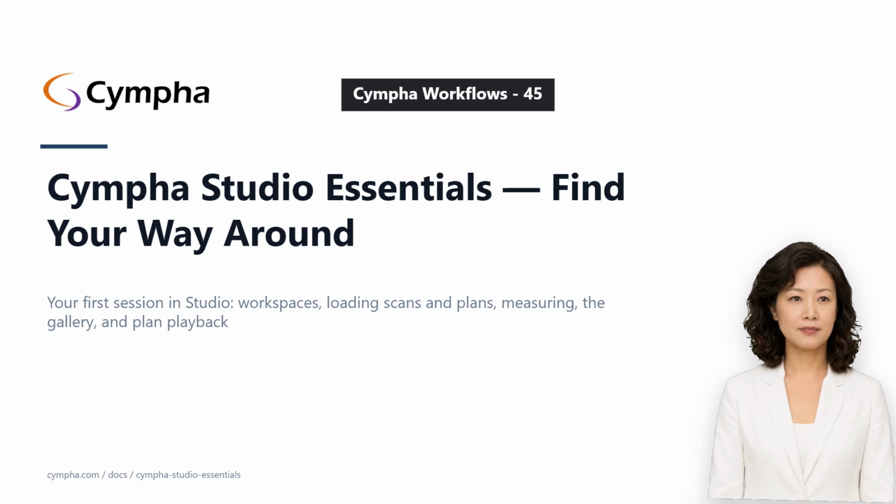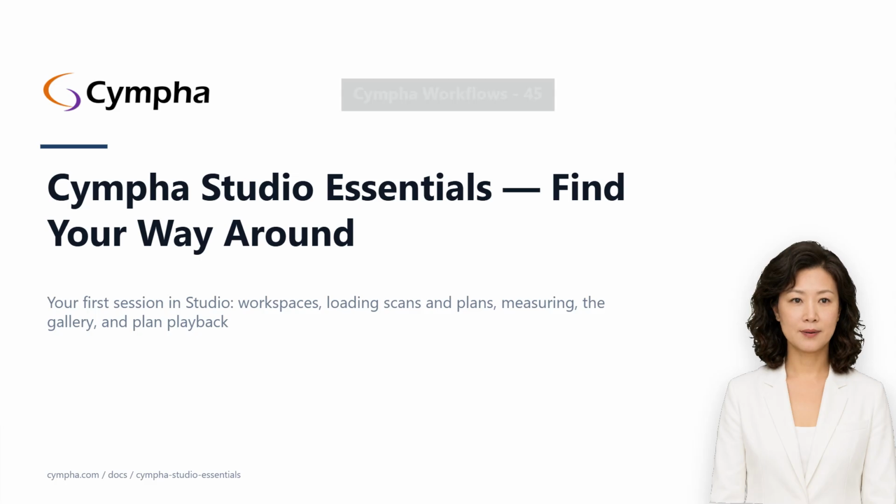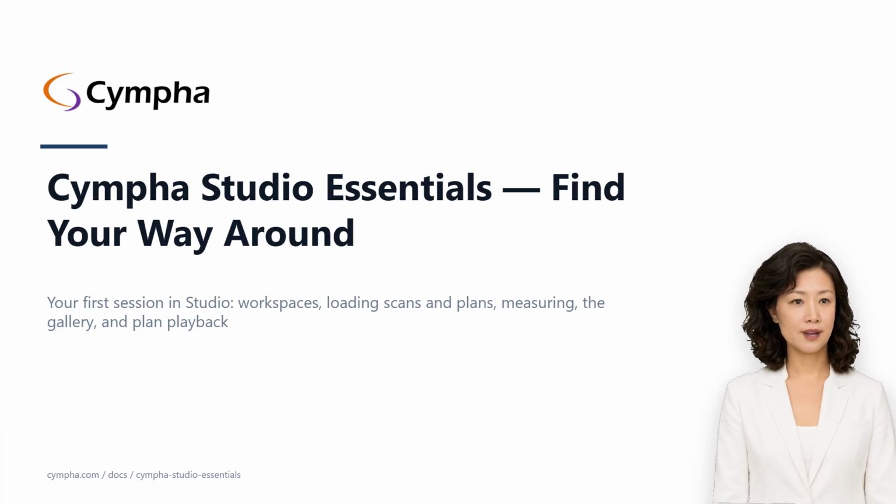Welcome to Guide Mia. Today we're going to talk about Cympha Studio Essentials, finding your way around Studio the very first time you open it. This one assumes nothing. Whether you're a clinician, a designer, or a patient who just received a link, no previous Cympha or 3D software experience is needed. Studio is a browser app.